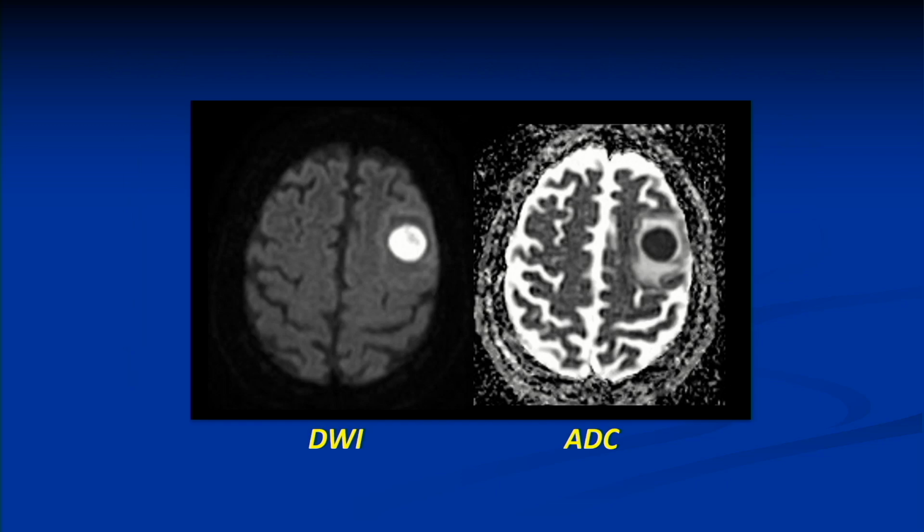And then as we know from sort of first year radiology, what do we look for? That intensely diffusion restricting center, which is indicative of this purulent viscous material. Very dark on ADC. And of course, our primary thought here in this infection lecture is going to be cerebral abscess. A couple of things about cerebral abscess though.